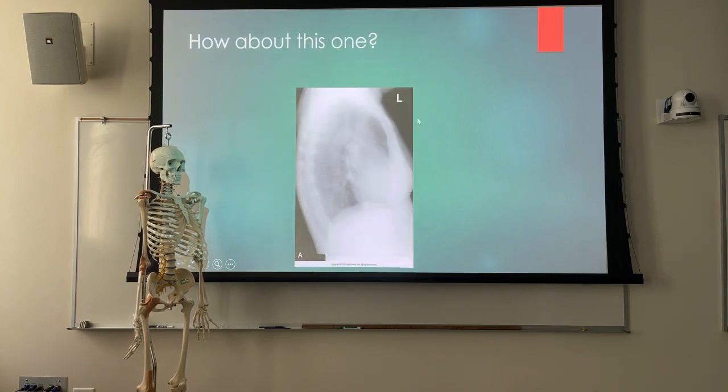And that patient looks like they're a bit more healthy, still have a bit of rotation. It's a little bit difficult to tell where what is. Don't really see a significant gastric bubble on that one, so I would assume that the right lung is posterior. Right lung is anterior.